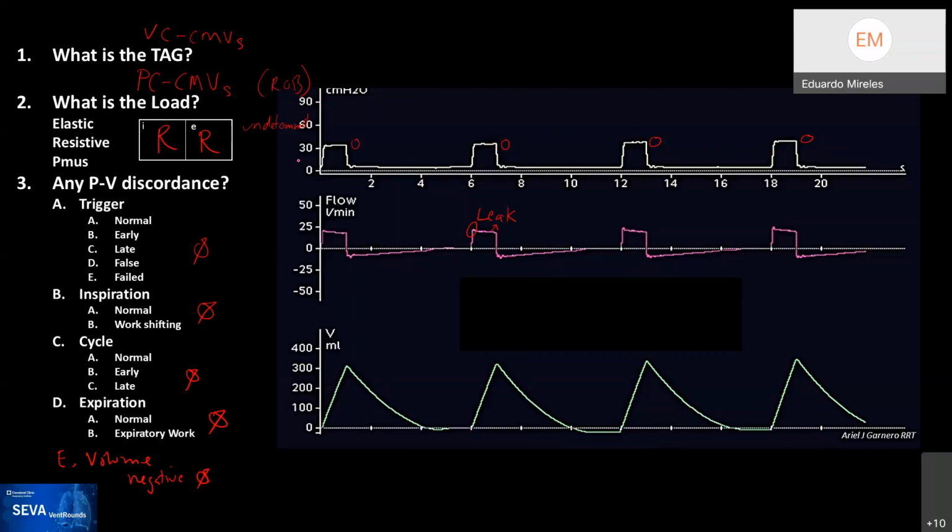this ventilator at that time, the gain is set too large, the scale. The same for the flow. So you lose some of the ability to see the differences between pressure, but now that you know that the pressure is increasing between each one of these breaths, does that change your taxonomy? Yeah, so the ventilator is automatically increasing the pressure. It'd have to be adaptive because it's not seeing the volume that you have set, whatever that might have been, because of the leak, right? Exactly. Yeah, that's a very subtle point. Very good.